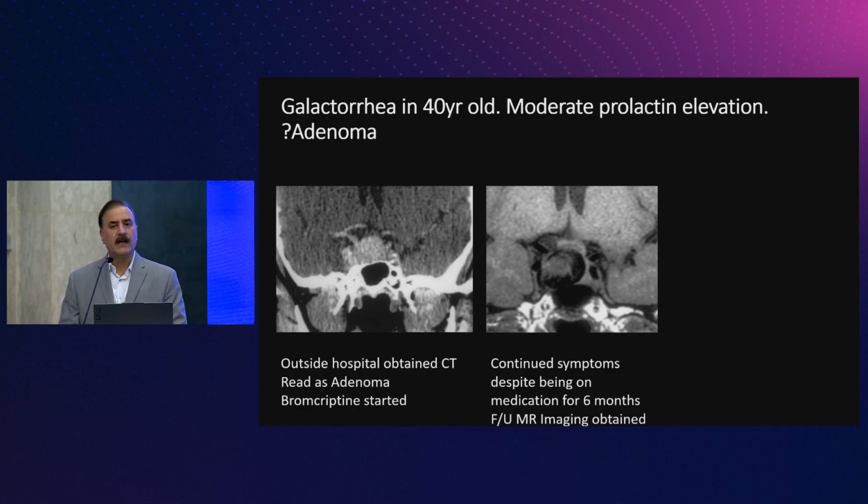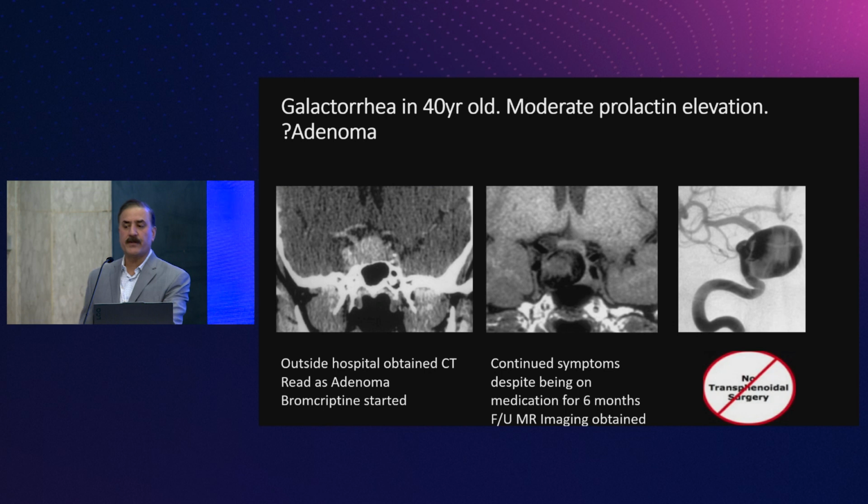Whenever you see dark signal on a T1 weighted image, obviously this is a little heterogeneous, you see some iso-intense soft tissue signal also, but there is dark signal around it. On a T1 weighted image, that can be air, dense bone, or high velocity blood. That's exactly what it turned out to be, a big, huge aneurysm coming off the ICA, and the patient got that treated and was happy.